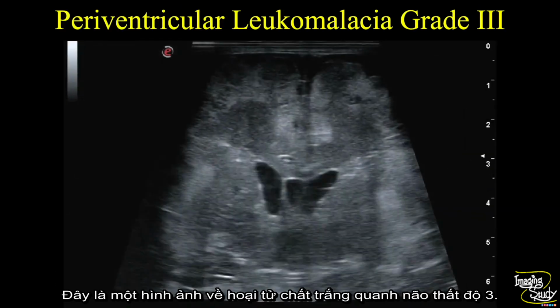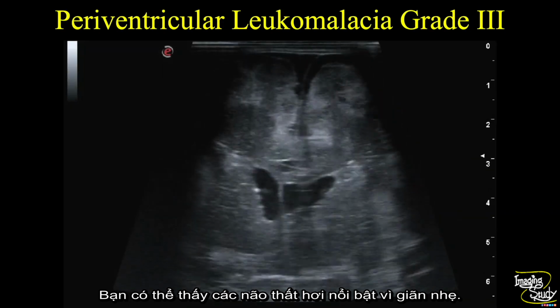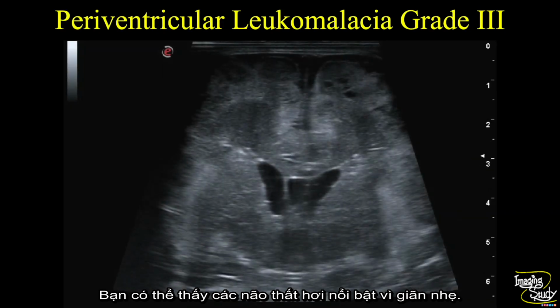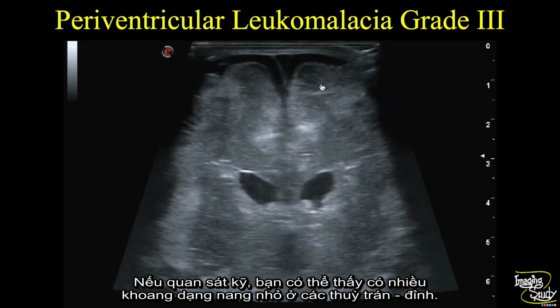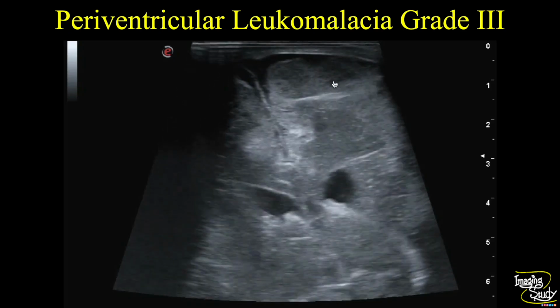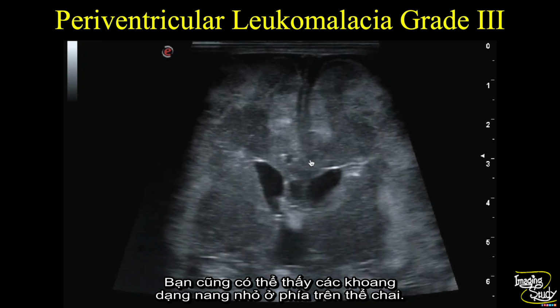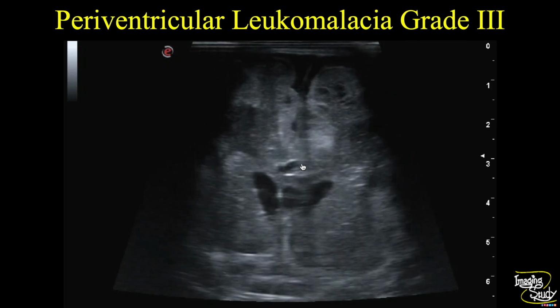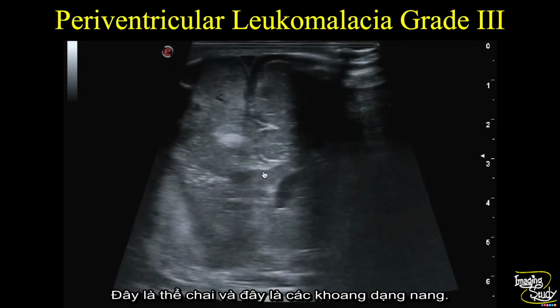Here's a picture of the grade 3 periventricular leukomalacia. You can see the ventricles are slightly prominent or dilated. If you check carefully, there are multiple tiny cystic spaces within the frontoparietal lobe. You can also see tiny cystic spaces superior to the corpus callosum. This is the corpus callosum and these are the cystic spaces.